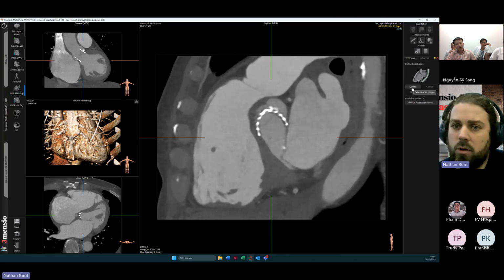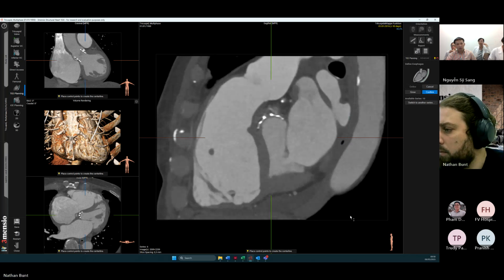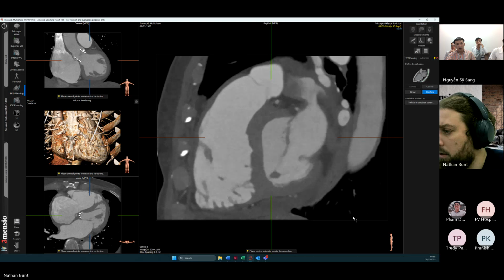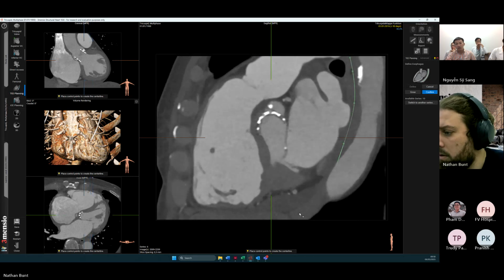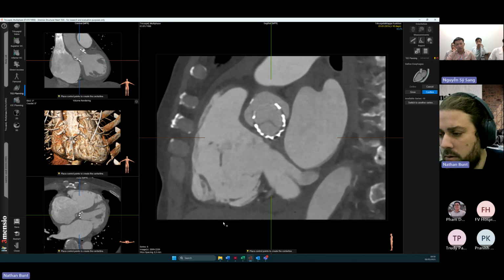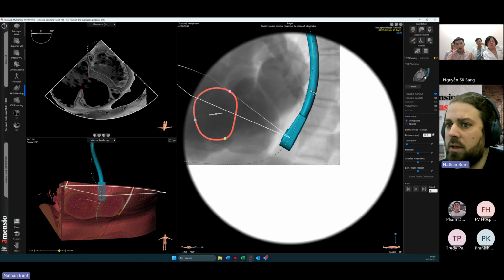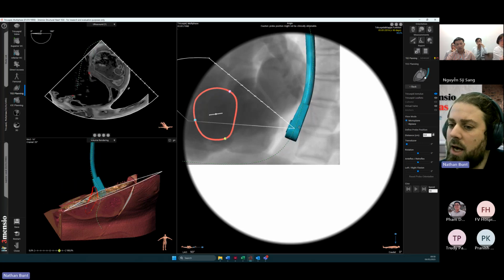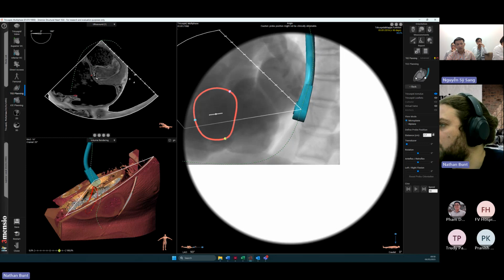So the first step of TEE planning is to define the esophagus. So we can locate the esophagus on the CT scan, then place a crude centerline in there. And then we could go all the way to transgastric even. This centerline can then be used to slide a catheter over. Let me just go back a second.